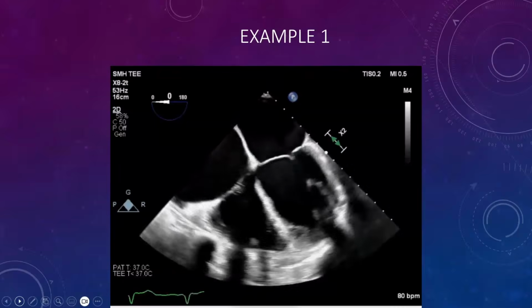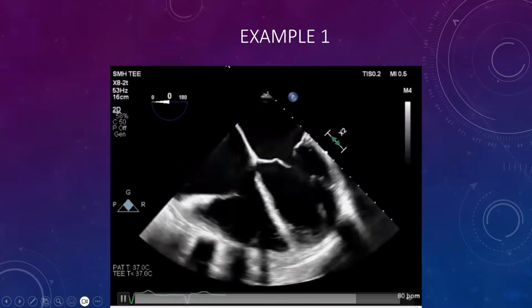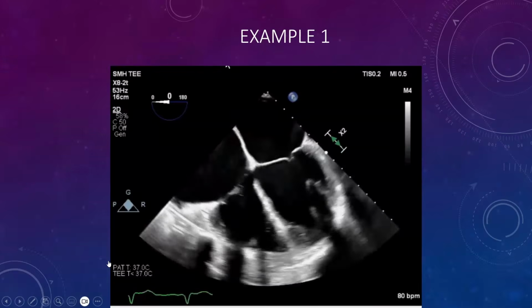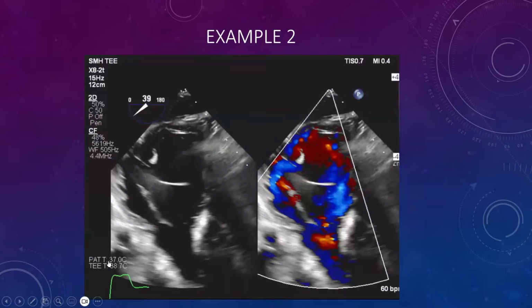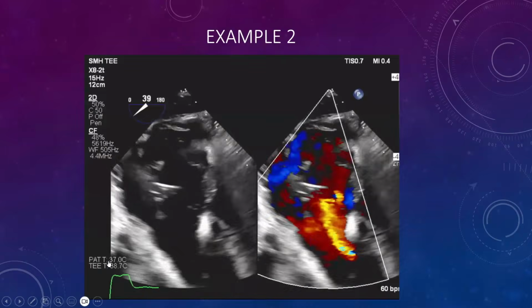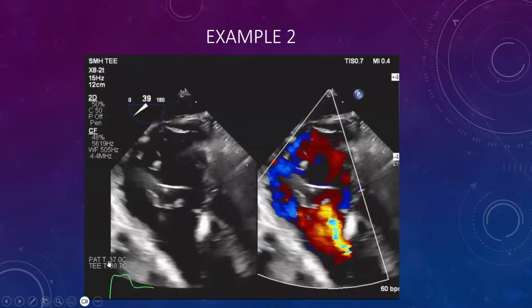Atrial? Yeah, so this is an atrial functional. You see the RV is not that big, but the atria are quite large, and you can see the flat coaptation line there. Good. And I'm going to show some more pictures for this example. So we have a lead here that's kind of in the middle.